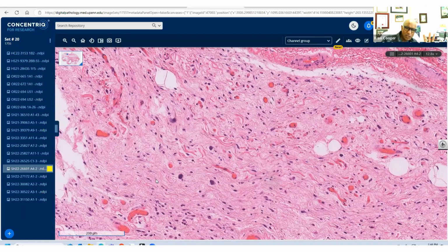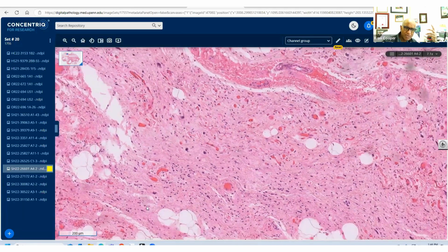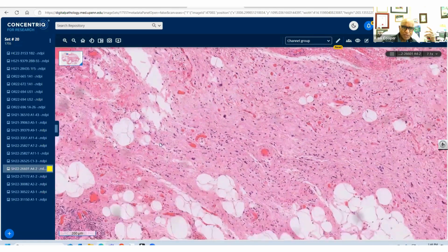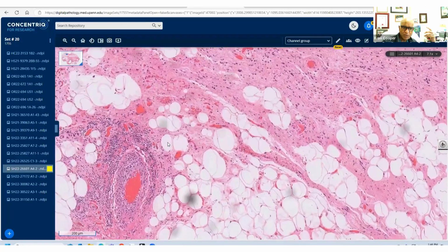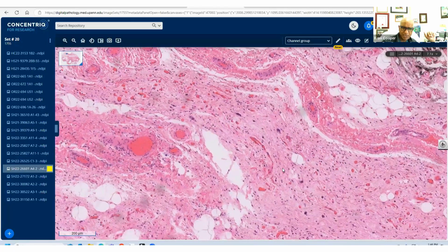Now, the key feature in that, Florence, is that you do not get atypia. If you have any atypia, then it is not a spindle cell lipoma, even if it's in that distribution site or anywhere else. So this has atypia. This is in the abdomen. So the site is wrong. Plus, we have some pretty ugly looking nuclei. There we go. This hyperchromatic nuclei. You will not get this in spindle cell lipoma.